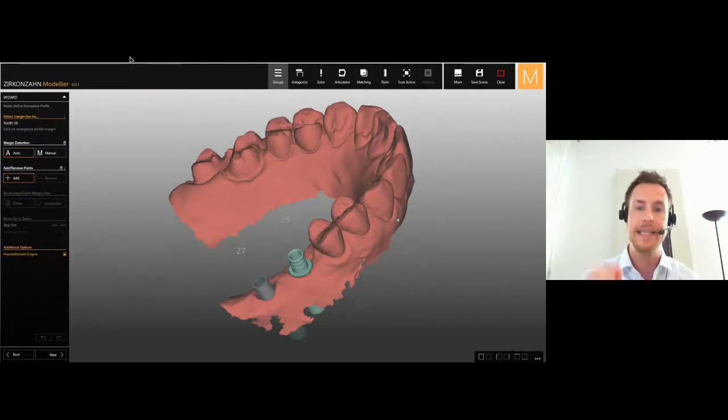Not only the teeth part, you also have to scan the whole palate, and if possible, also the tuber region where the hamular notch is, because then we can use a special measurement workflow to know the tooth placement in the end. I will explain and show you in more detail later.